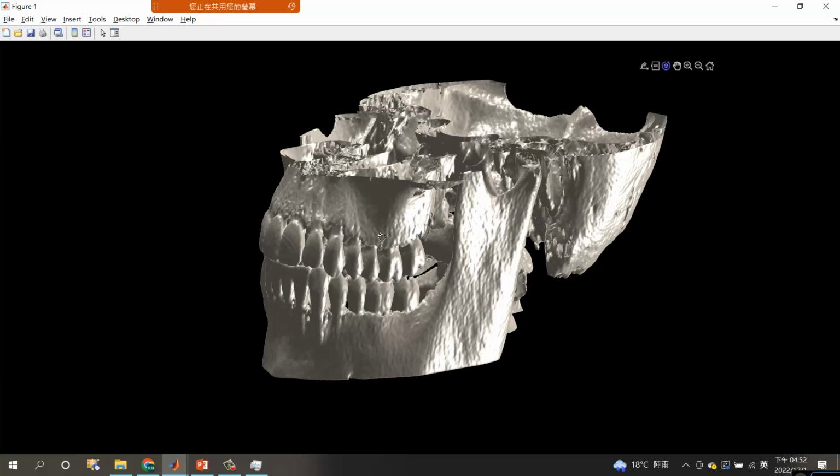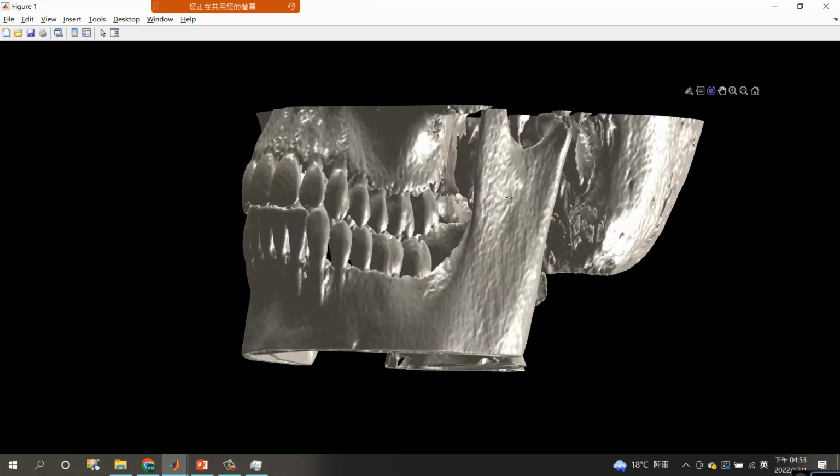Once you did it, just tell me, is this model pretty enough, good enough? To me, I have to say this is not good enough. You can see the surface is not smooth, right? So we definitely need to do something to improve the quality. But anyway, just try to observe this 3D model by yourself right now.